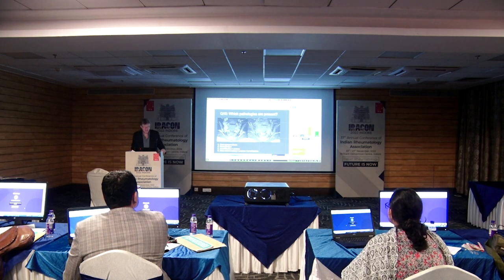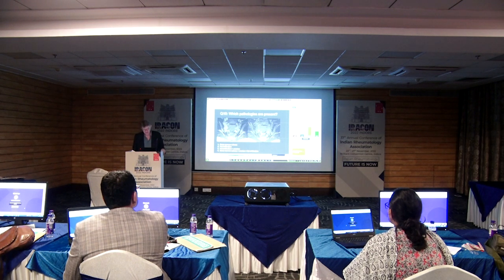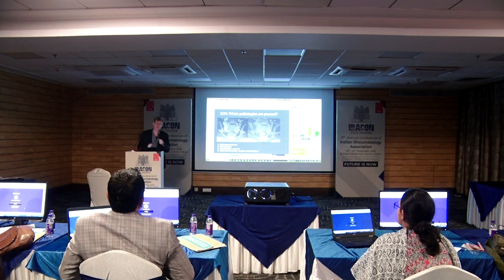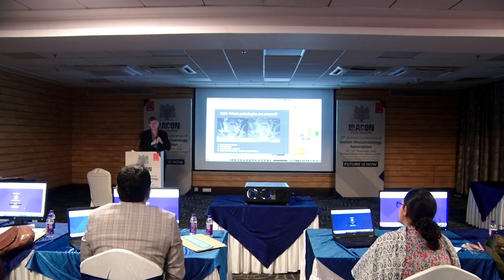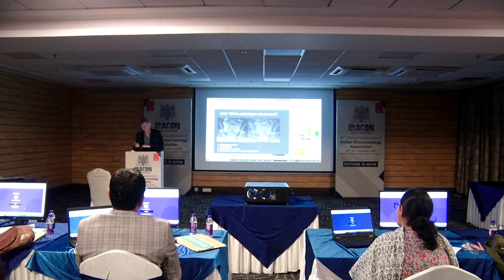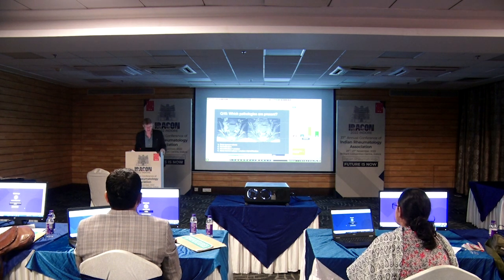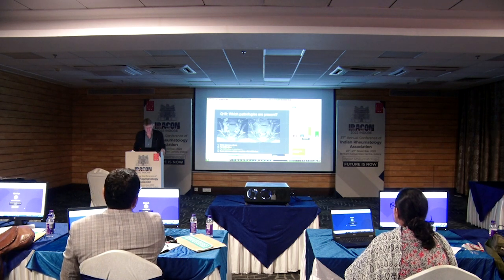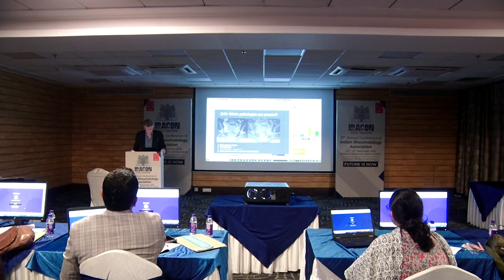And the fact that there's an erosion there is the challenge, because I guess that those of you who said bone marrow edema would say that this was bone marrow edema. That would be my guess. And it's actually not bone marrow edema because there's an erosion. So the bone has been destroyed, and thereby it's more watery tissue inside the erosion. And therefore it's not in the bone anymore, and therefore there's no bone marrow edema. But again, it's definitely still a good answer.